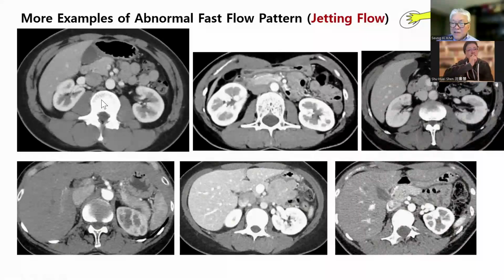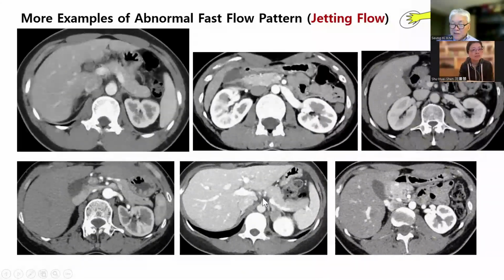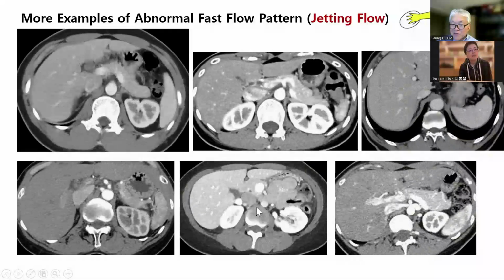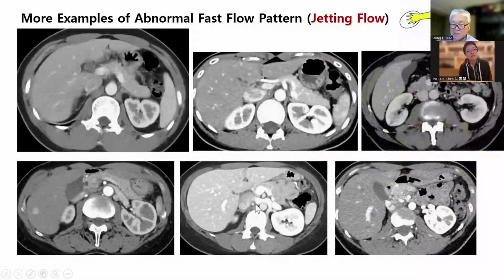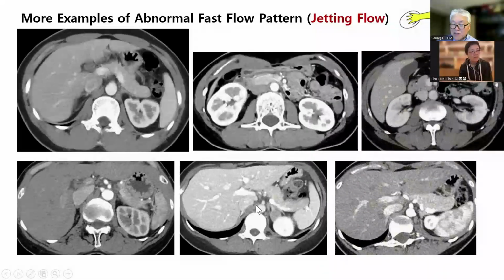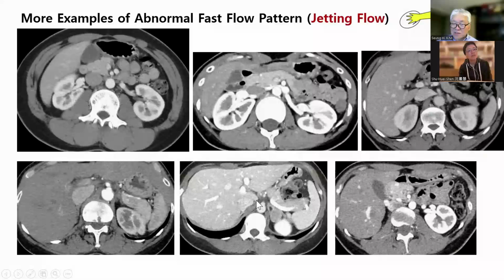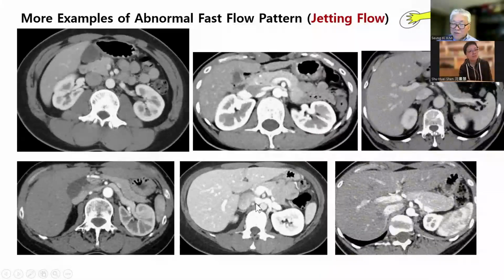So I think if you see this CT, probably that is a type 1 component between the aorta and superior mesenteric artery. And also there is a right renal artery you can see. And in this patient, this portion is compressed by the right renal artery. So I think this patient is type 1 and type 2 nutcracker. And the spread of the contrast after it passes the compression point by the right renal artery.